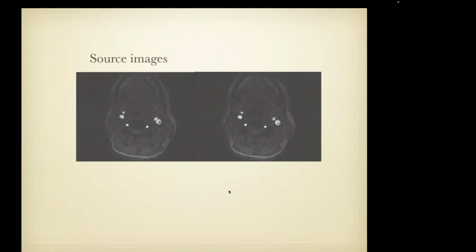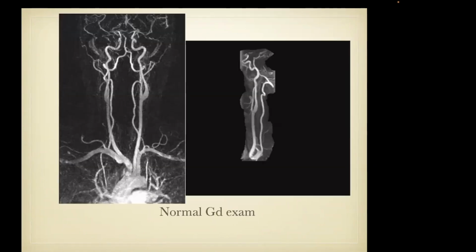Now, you say, well, I don't see that in all my patients. Well, we tend to do the MRAs in older patients who have lost their carotid bulb due to age-related changes, atherosclerotic disease, and so on. And so we see less of this recirculation of flow. Here's the gadolinium study in that patient showing you a completely normal carotid bulb.